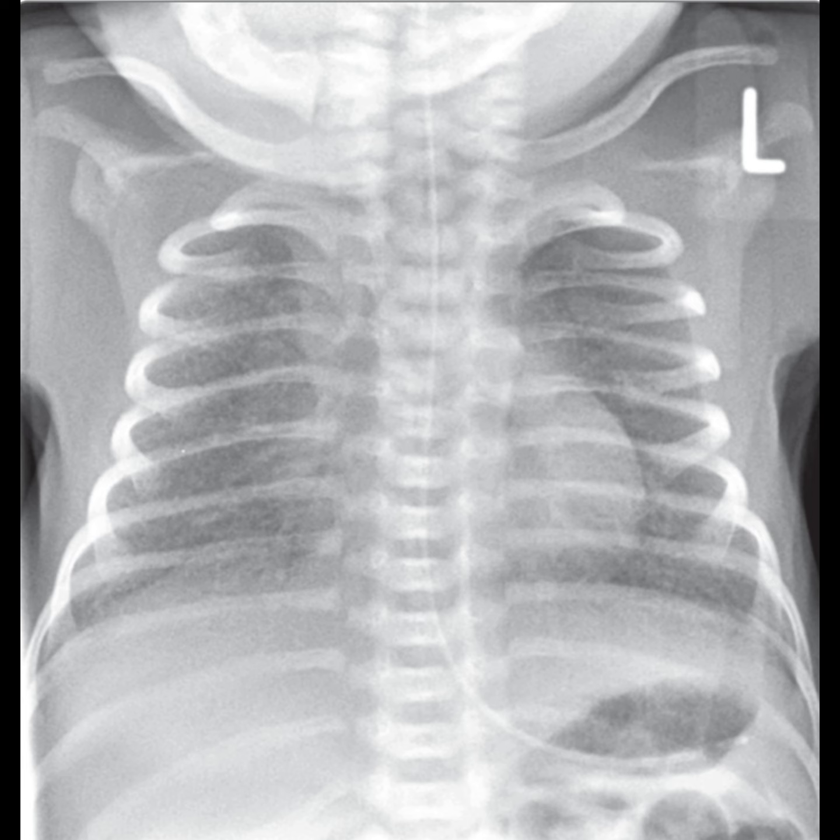It's also vital to keep an eye out for complications like pneumothoraces, which can arise secondary to meconium aspiration or complications from intubation, and pleural effusions, which are more common with meconium aspiration. Don't forget to assess the cardiothymic silhouette carefully, and examine the heart and pulmonary vasculature for signs of congenital heart disease. These are key elements in a comprehensive evaluation.